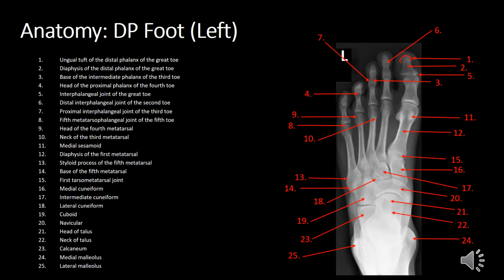This image shows the dorsiplantar, or the AP view of the foot. Take some time to look at the normal anatomy here and remind yourself of the individual components. You may wish to pause the video until you've completed that.